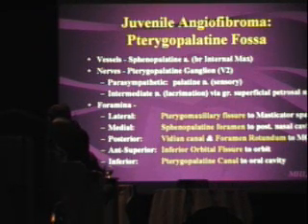The only time you'd ever give a differential diagnosis is if it was really centered in a different space. You have a kid coming in with a lesion that looks like that, but it's centered in the bone and not arising from the posterior wall of the nasal cavity or from the pterygopalatine fossa, but arising from the bone and displacing the fat in the pterygopalatine fossa, which is your clue. Then you might think, well, what are malignant-looking bone tumors that kids get? You know, Ewing, rhabdomyosarcoma, but even more common would just be EG. And when we've seen this appearance in the past, it's been eosinophilic granuloma.